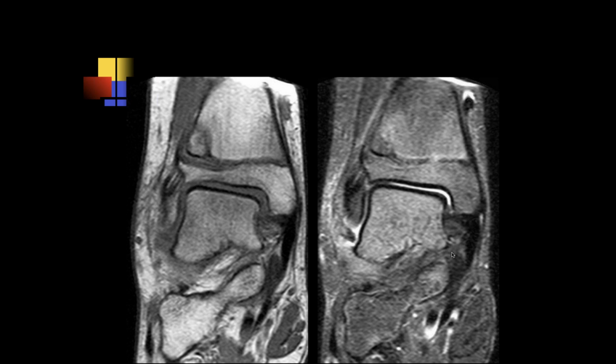Jennifer. Okay, so here again we have a pediatric patient. The physes are open, and we have this oblique fracture extending through the lateral tibial metaphysis. I don't see any definite extension through the epiphysis, so this is probably a Salter Harris 2 fracture. Good.